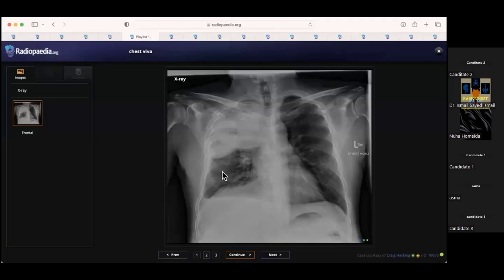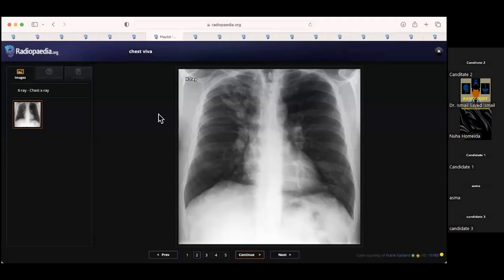Not sure if Streptococcus pneumoniae may also, that's down the line, but the other organism that causes bulging fissure is Pseudomonas. Yes. So that's just a classic Klebsiella, causing the bulging fissure. And you're right, we do a follow-up just to ensure that it's completely resolved, or sometimes they get complicated by cavities and lung abscess and others. So that's a young patient who presented with shortness of breath.